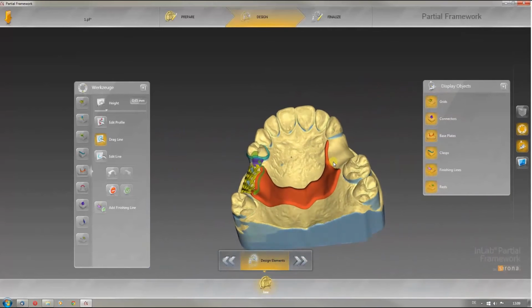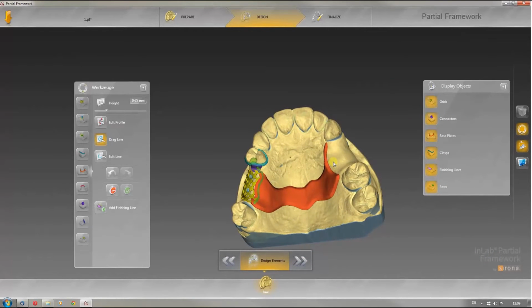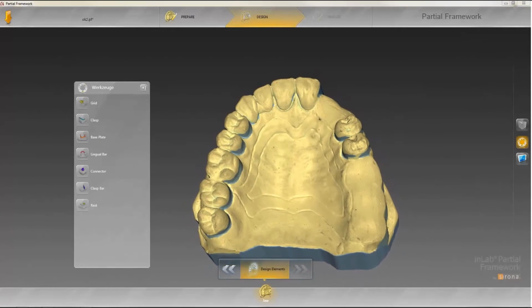In the finalizing step, all data of the elements are collected here and fitted together. Before coming to this step, the design of a palate-free area on the maxillary baseplate, as well as the design of a sublingual bar for a denture in the lower jaw, will be demonstrated.